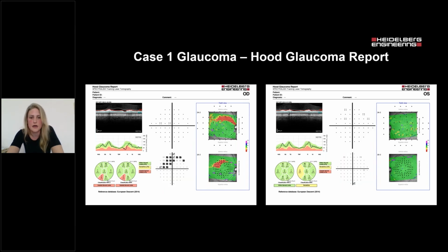And in our patient, it clearly shows the structure-function relationship between the inferior macular vulnerability zone and the upper visual field loss in the 10-2 of the right eye. And notice that we can miss the macular damage in the 24-2.